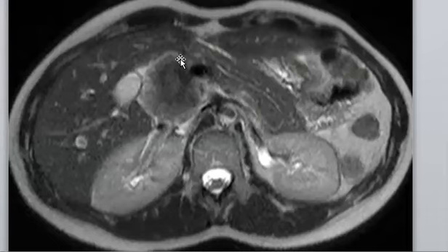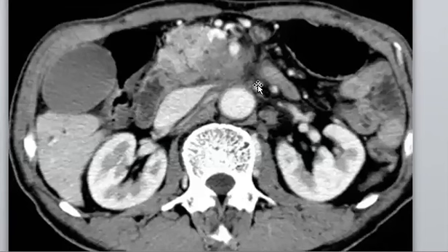Yes, there is a mass here. Pancreatic head, yeah, pancreatic mass, cancer or adenocarcinoma. So when you mention adenocarcinoma or pancreatic head mass, and it comes to you as a long case, the most important thing to comment on is whether it is operable or not. Perfect. So you should mention that it is operable or not.